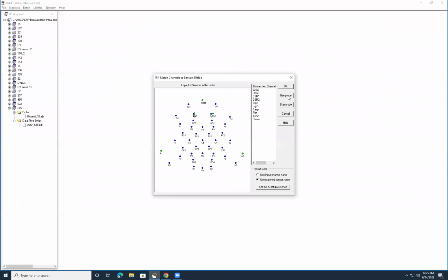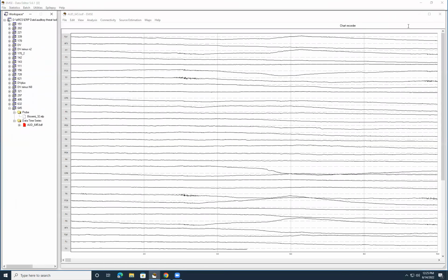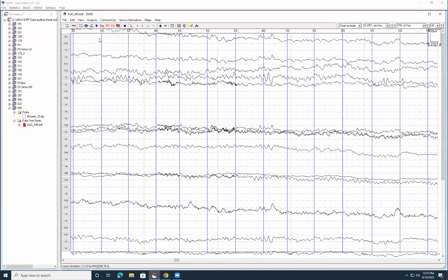All right, so we open this up just like we always would. You can press OK here. You don't have to do anything. It loads the file. We always change this to 150. Some nice messiness and noise going on here, which is exciting. All right, but then you're going to see it's going to settle down.